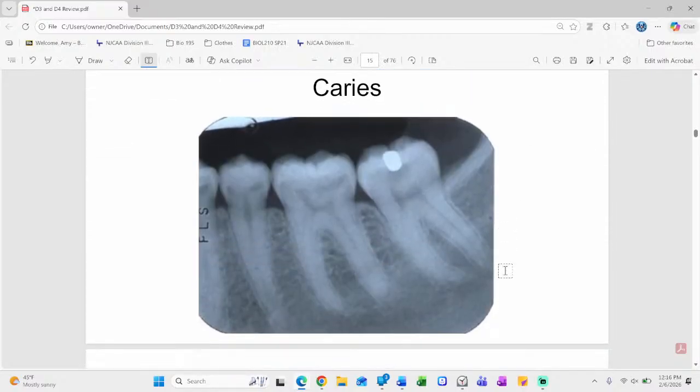Class 5s, you see your smiley faces here. Little class 5 caries, whether recurrent, whether occlusal, whether this is a buccal pit or not for sure, but probable recurrent underneath. Bone level's good, right? 1 to 2.5 or so millimeters from CEJ, so the gurus say.